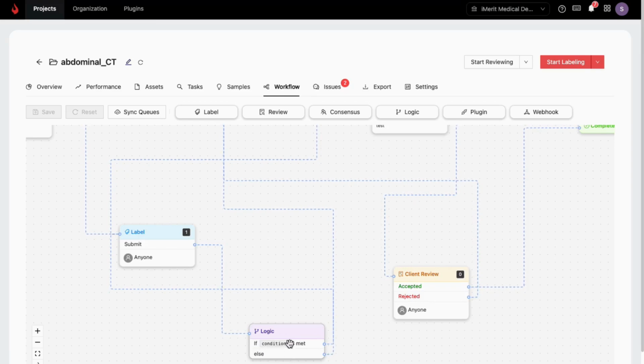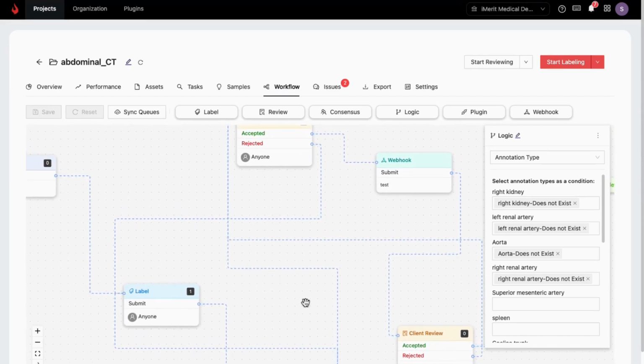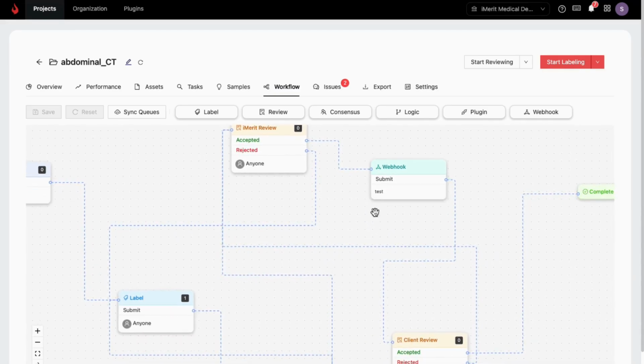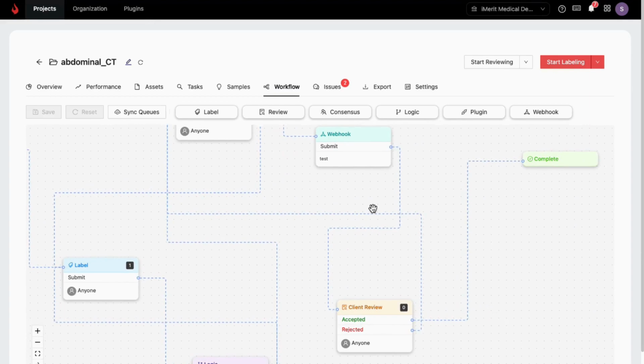And so here you can additionally set up logic within your workflow. So if you set up a flag that needs an escalation to a second level, we can also set up webhooks so that a message can go out, say if your expert is on call to review data, and then we can additionally create audit steps that are based on a random selection of data.